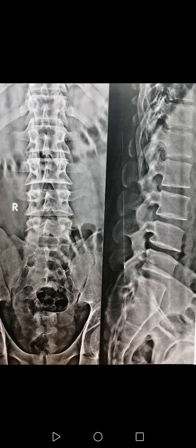Bismillahirrahmanirrahim. This is the first video of a new series aimed to comment on some imaging, MRI, X-ray, CT, and so on, regarding rheumatology and musculoskeletal system.